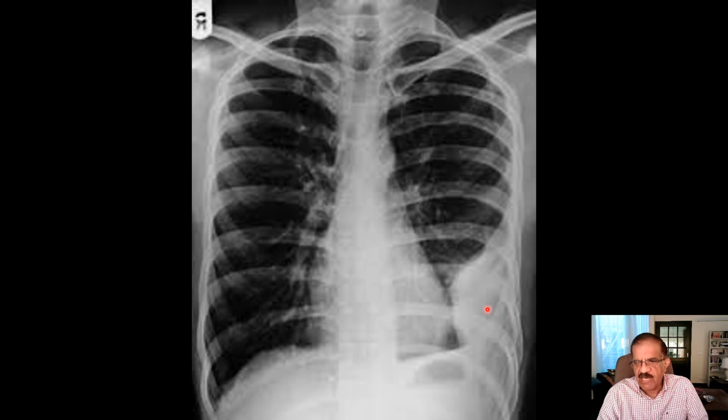In this case, the lateral film will be really helpful, especially if you want to do paracentesis, if you want to remove fluid. I think you need to either do a lateral film to exactly localize where in the chest wall it is loculated, whether in the posterior part or the anterior part. The lateral film tells, or you may do an ultrasound. But on PA film, it would look the same. Encysted pleural effusion, most probably due to some pleural inflammation.